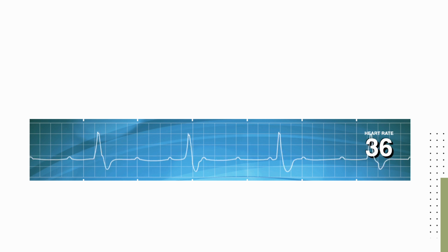Our final heart block is a third-degree or complete heart block. In a complete heart block, the atria and ventricles are no longer talking to each other. There are lonely P waves that are not accompanied by a QRS complex. A good rule of thumb is that if you see more P's than Q's, you should get moving. These are chaotic PR intervals, they make no sense and they don't line up. However, if you were to map out the P waves across the rhythm strip, they would be moving at their intrinsic rate set by the SA node. The SA node is trying its best to talk to the ventricles, but the ventricles aren't listening.